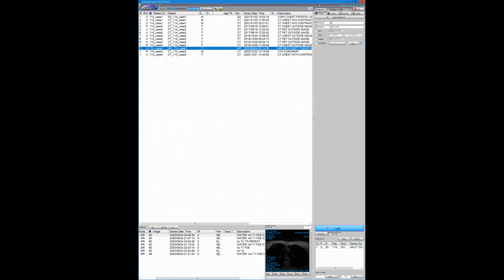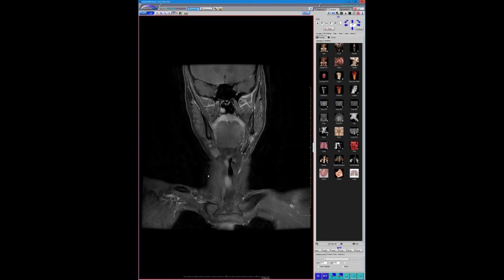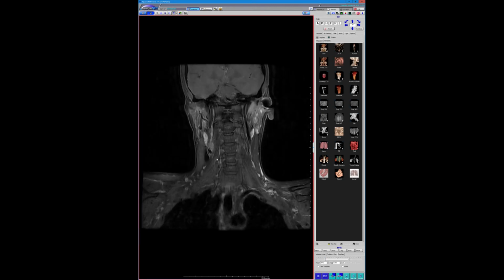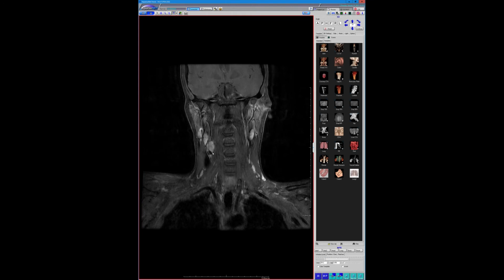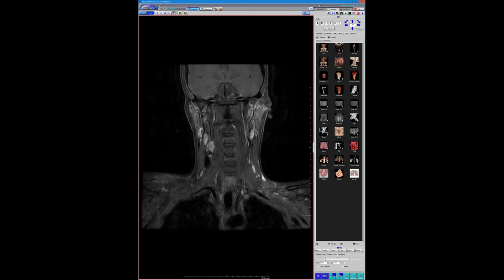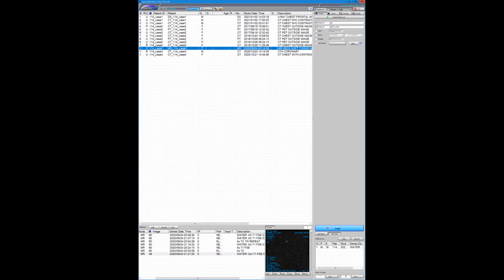Yeah, here's another outside CT on it. And it's just never really well seen. We did a coronary CT on it. It wasn't well seen. You see it, but there's always motion right in this region. We did an MRI, and it just wasn't done well, and it's hard to see this little thing, especially in the coronaries.